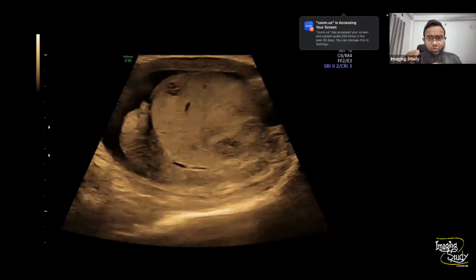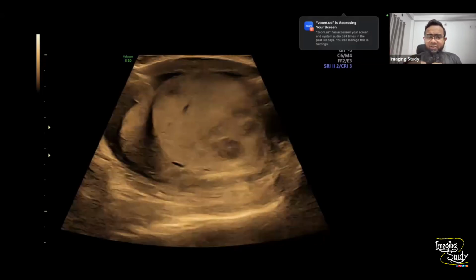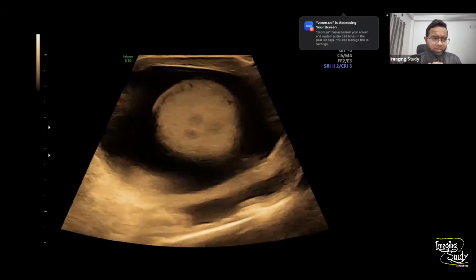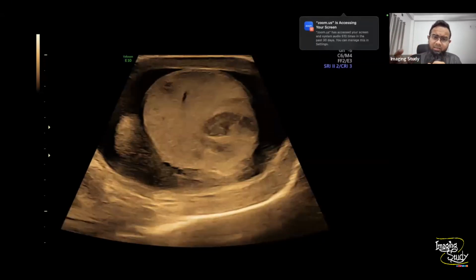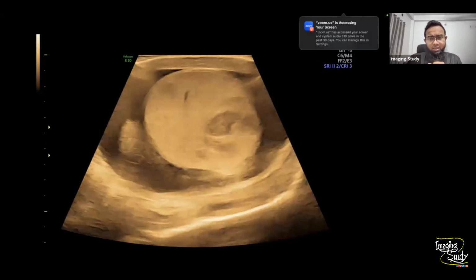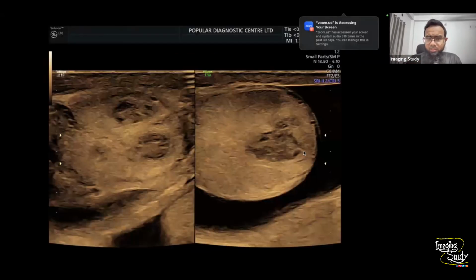Usually testicular malignant lesions show high vascularity. And obviously, if it is a necrotic lesion, then you won't see any vascularity. So we want to put some Doppler and differentiate between these two. So let's see the picture. You can see these are the areas of interest for us.